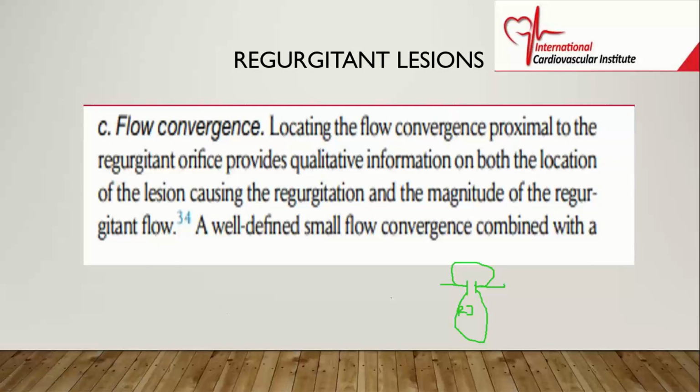So this is the flow convergence. These hemispheric shells are not a complete sphere, they're half of a sphere, hence hemispheric.